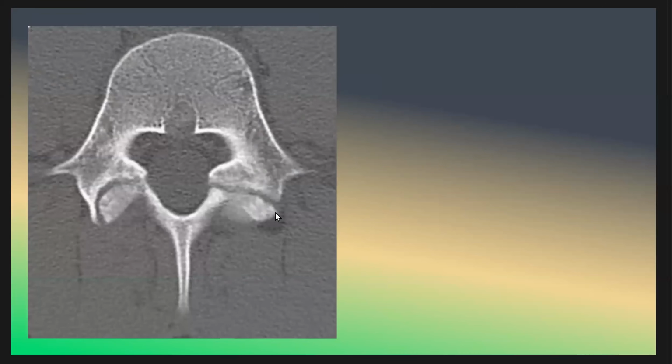Here this patient has a CT scan and we see bilateral spondylolysis, or pars interarticularis fracture. So this is a pars interarticularis fracture, or spondylolysis.